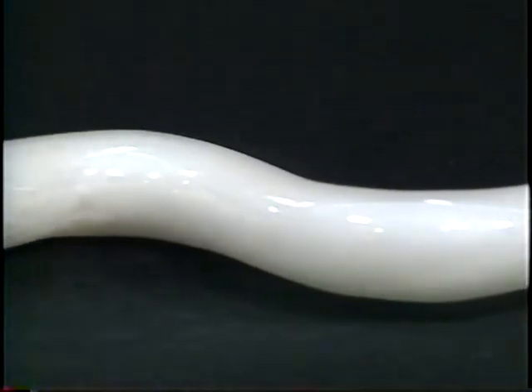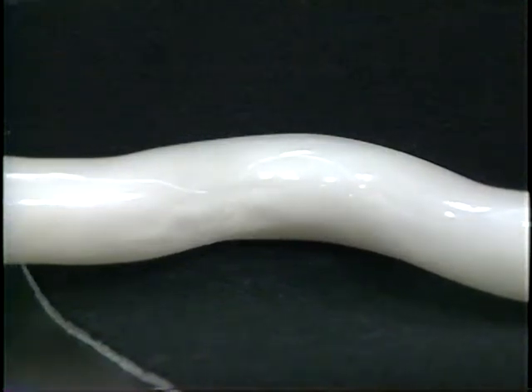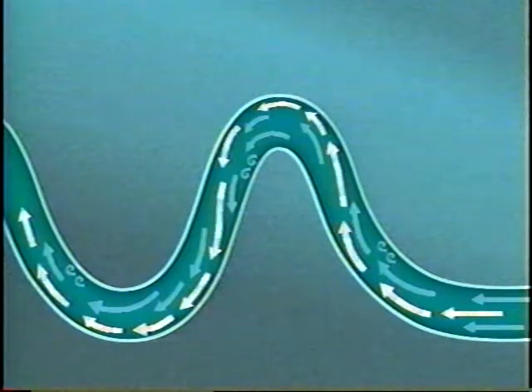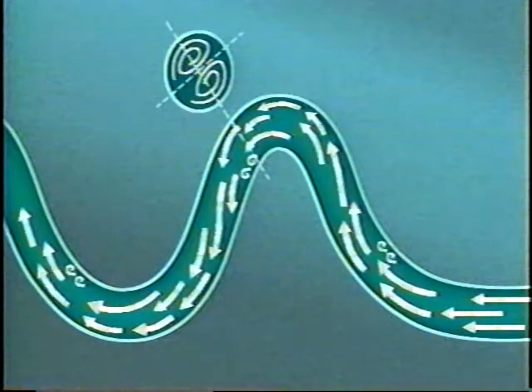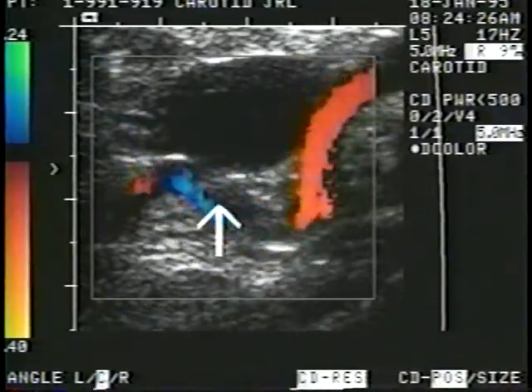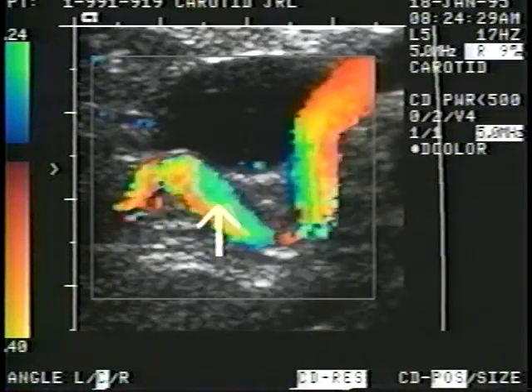Module 2 demonstrates tortuosity in a vessel. For optimal viewing, one should adjust the flow rate to fast. This module shows the effects of curvature to the streamline profile. The fastest moving fluid at the center of the vessel accelerates toward the outer edge of the curve, skewing the streamline. This acceleration causes a rotation of flow, and a helical component is observed as the flow exits the curve. The colors in this duplex segment change as the velocities accelerate along the path of the streamline.